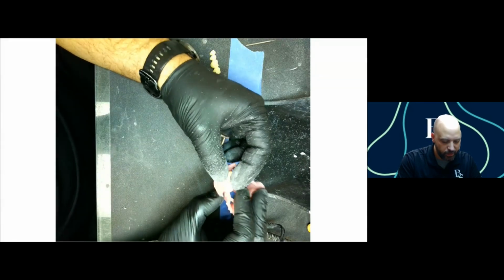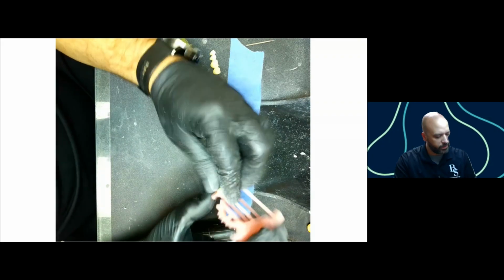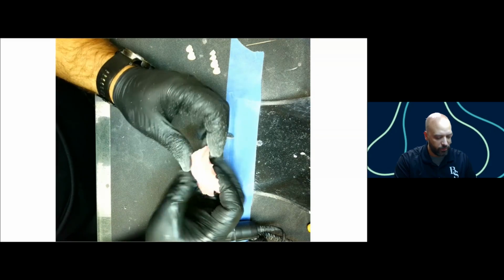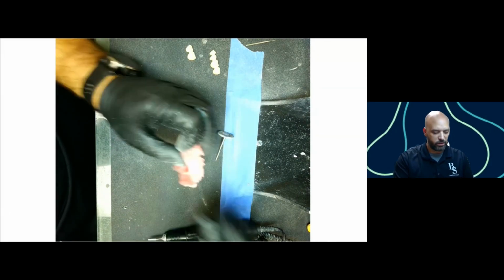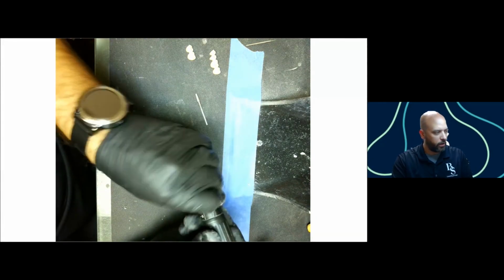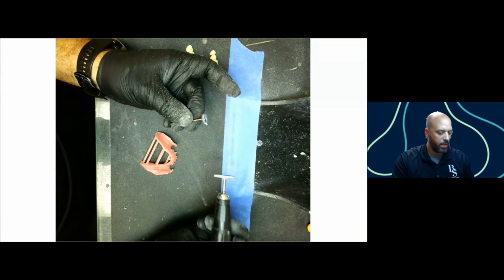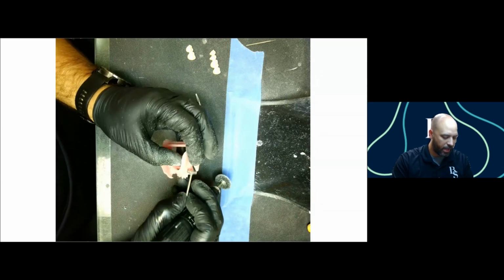So now I'll test fit this side. That fits in there really nice. So the last thing I have to do is finish up the borders here and get rid of all the nubs that are on here and any little areas where I've got support still. So this one, most importantly, I'm going to go back to my wheel here. And I actually have one that's pretty well worn down. This is for getting into tighter areas like in here where I've got the clasp.